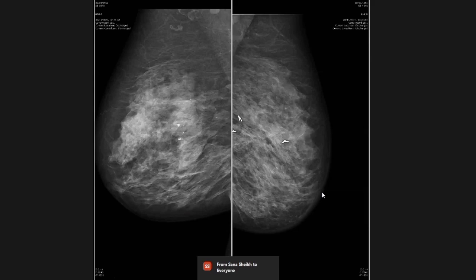Also, there is no evidence of architectural distortion, any skin thickening or nipple retraction. A few rounded radio-opaque lesions are noted within the axillary region. These are consistent with lymph nodes, but they have preserved fatty hilar regions. As I cannot appreciate any clear-cut discrete lesion and I can see only a few specks of calcification, I would likely go for an ultrasound of the patient, or any previous imaging to compare if there is any occurrence of a new lesion.